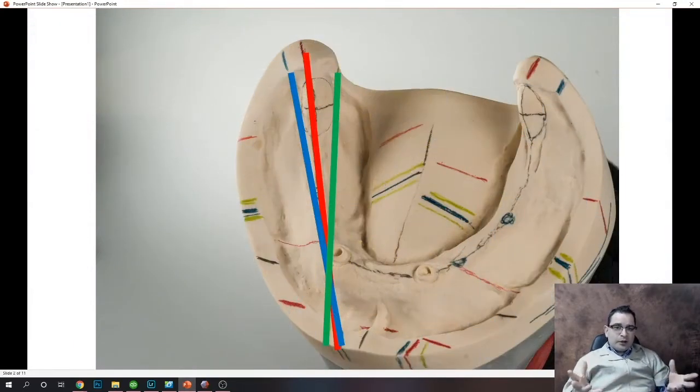So these are just regular models. I still do, and probably will for a long time, do quite a bit of analog work. But the same model analysis works surprisingly well for both analog and digital. What I wanted to show you is you see these three lines right here. The red stands for static line, the blue for outer correction, and the green for inner correction. What it basically does is utilize those anatomical landmarks to create this triangle.